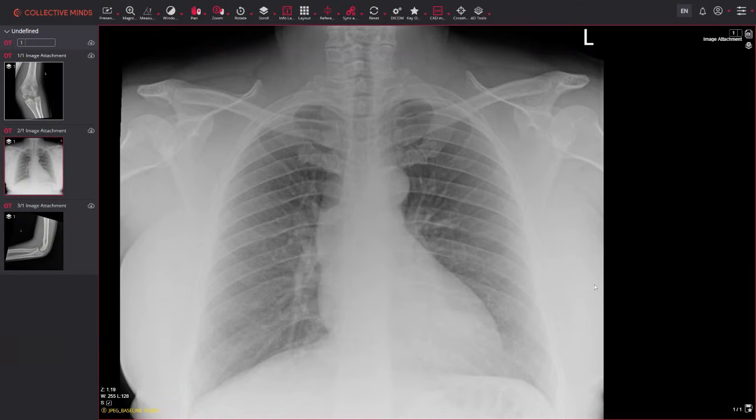Have a look at the soft tissues, okay? So they might have subcutaneous emphysema if they've had a penetrating injury, if they've had any recent surgery, if they've got a pneumothorax. There may be a mass, there may be some calcifications, and have a look, if it's a female, have a look at the breast tissue as well.